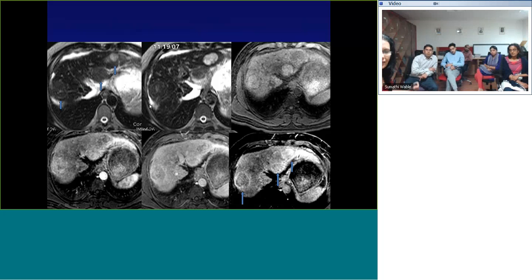This is where you have to have everything that you have at your disposal. You can see the T2 weighted image, again, a lobulated liver, consistent with cirrhosis, some free fluid. Several lesions, 1, 2, and 3. These two are minimally hyperintense on T2.